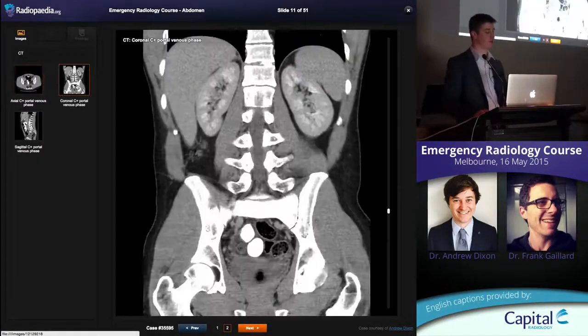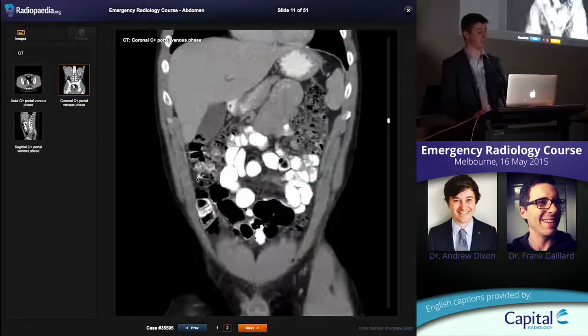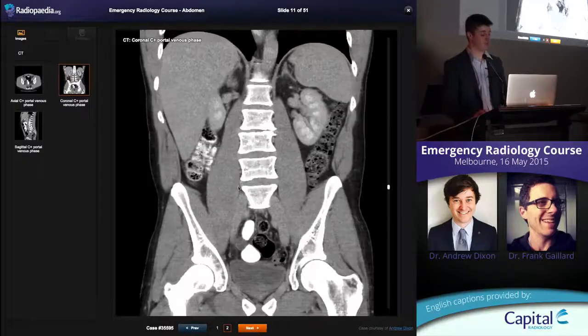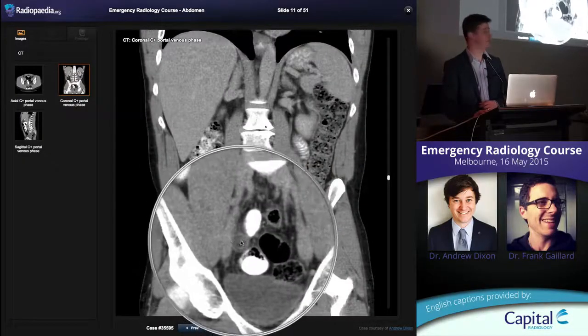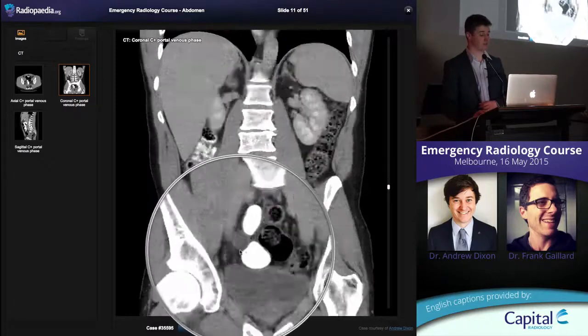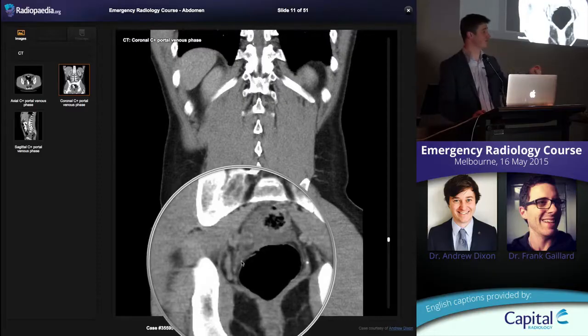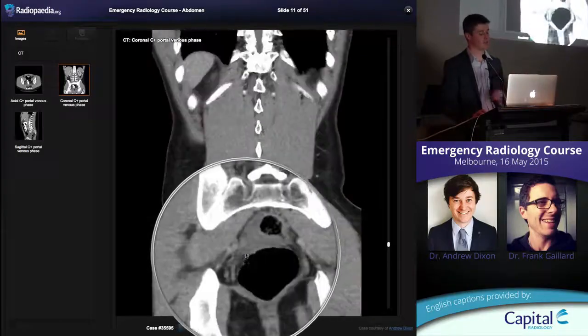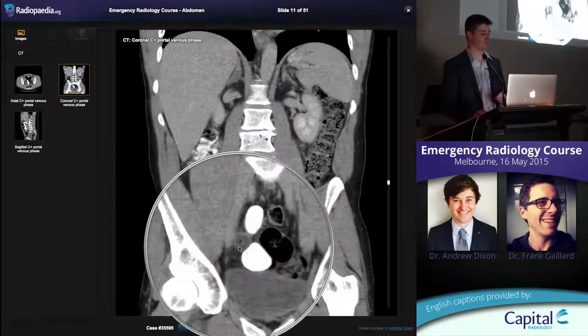So my tip for how do you find it, and this patient obviously has very little intra-abdominal fat and quite distended, fecally loaded bowel, which makes it hard. Coronal image is much better. You get a nice corresponding image to that target sign you might see on ultrasound, okay? But the key here is that free fluid. Detect that little bit of free fluid. In a female patient in menstruating years, you can have a little bit of physiological free fluid, okay? In a male patient, no free fluid is allowable. There must be something going on, okay?